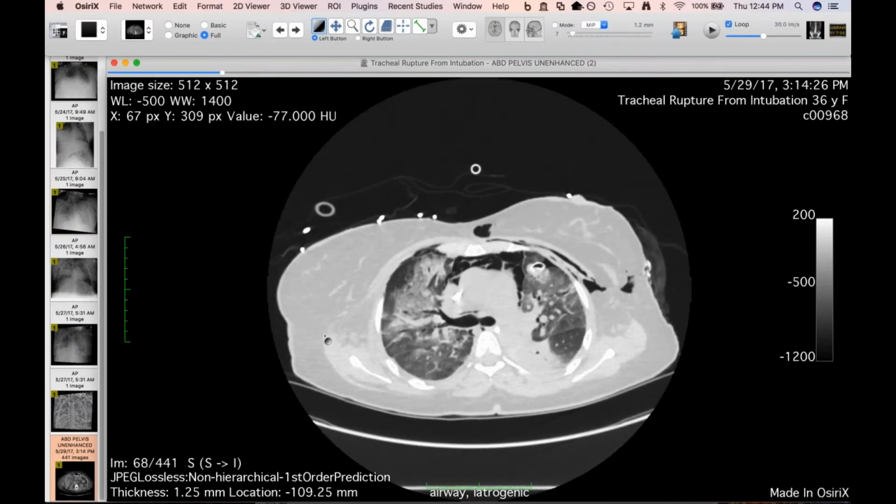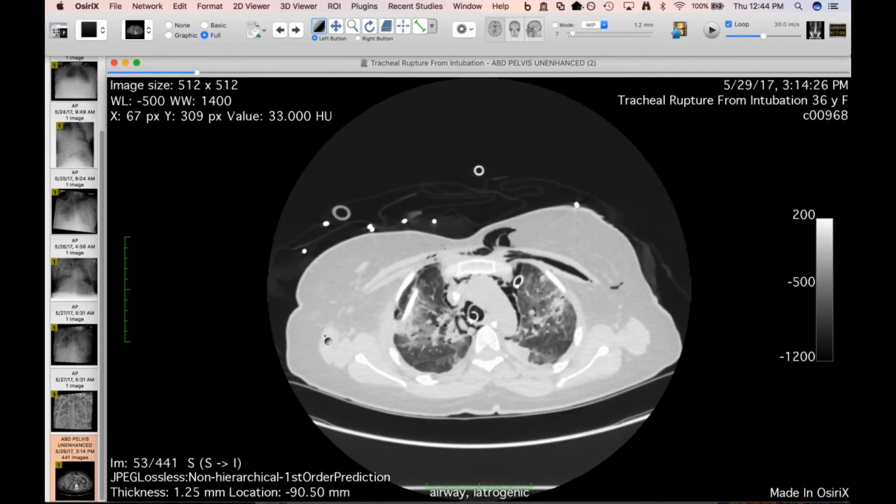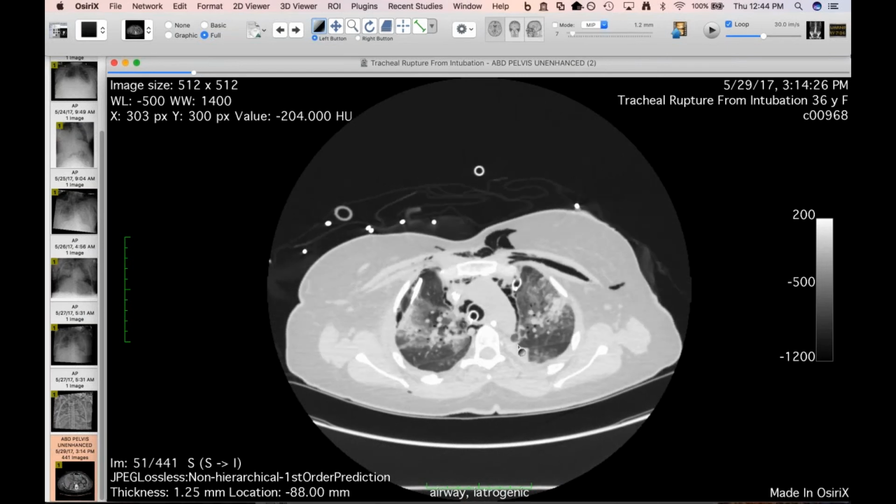People spend a lot of time discussing the lungs and trying to figure out what was going on with her lungs. But like I say with ICU radiographs, I think this leads more evidence to the fact that the lungs are the least important part of ICU CTs too. So here's the chest tube on the right going straight into the lung parenchyma surrounded by hemorrhage.